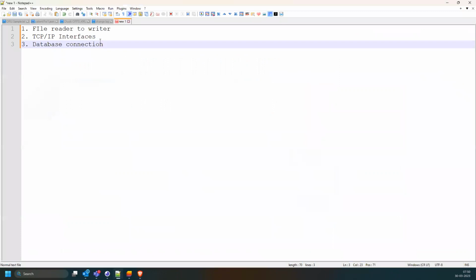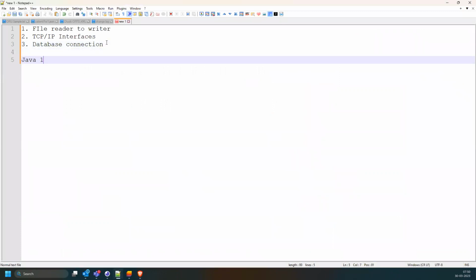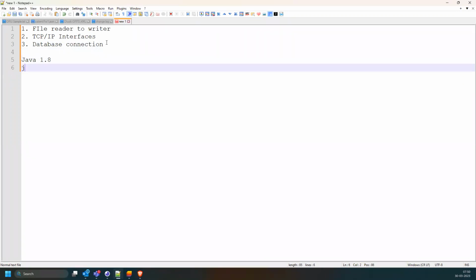So you need to install Java version 1.8 or Java 11. Mirth Connect is a Java based application. So as it is a Java based application, you will have to make sure that Java is available for you guys.